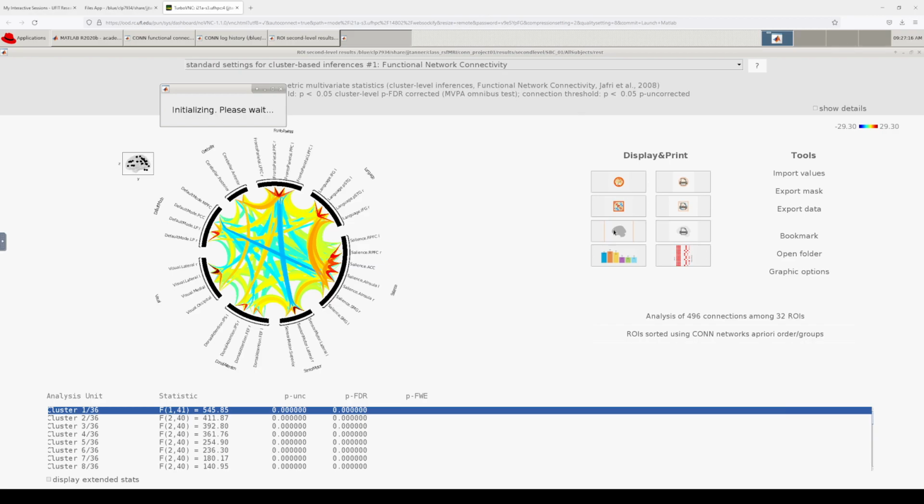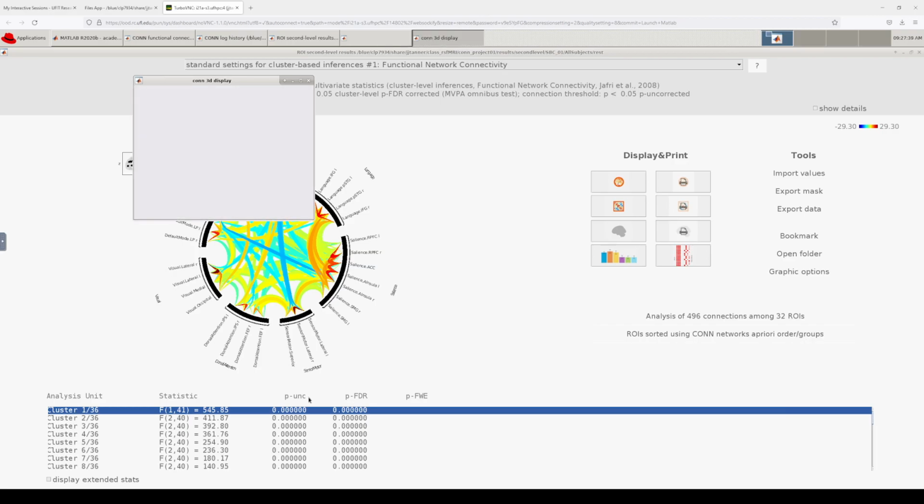So you could submit a screenshot of that, and that would be fine. This is just inherent to everybody. This is what connectivity looks like. Again, we haven't really done any interesting analysis. This is just all 42 people. Do we see these brain networks? But then we can get into age, or is there a sex or gender difference, or whatever covariates you have.